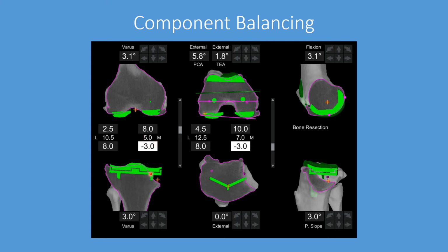And we want to keep it below 5 because above 5 degrees is when we will need a structural augment. When we look at the tibia from the axial view, we can look at the area, and from the side we can look at the volume. And from the area we can see that even though we have this defect, over 80% of our plate will be supported on host bone.